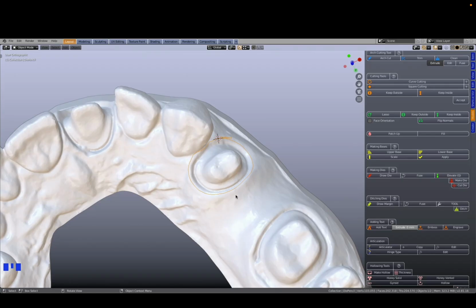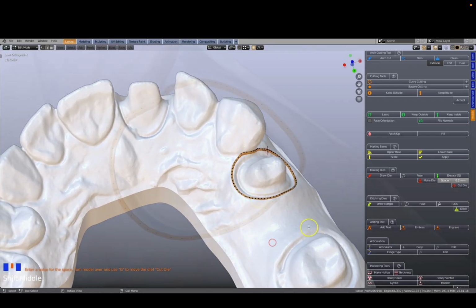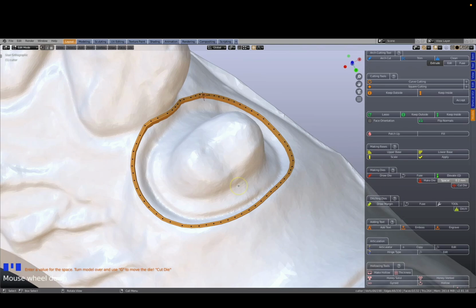This will not work. The extrusion process happens in a direction away from you, in a direction that is parallel to your eyesight. Once you are satisfied with the position, go to the Model menu, and press on the Make Die tab. Notice how this has created a cutting tool, which penetrates all the way through the model. By inspecting the upper part of the tool, one can now appreciate why the cutting tool has to originate from a point well above the surface of the model.